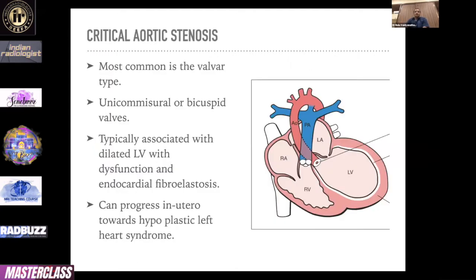So that is not much about hypoplastic left heart syndrome, which I am sure that most of you will easily pick up. So today you learned this additional point about pulmonary vein Doppler in this setting. Now let us look at critical aortic stenosis.